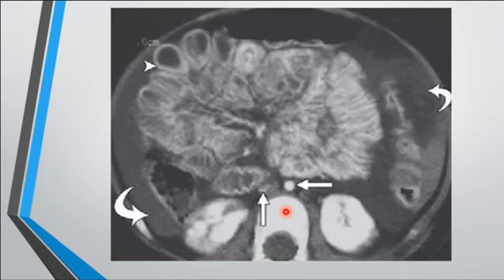So overall, bowel shock or hypoperfusion complex. Small caliber aorta. The vessels will contract in order to preserve flow to vital organs, like for example the brain, the heart, the kidneys, and to decrease perfusion to less vital organs like the upper and lower limbs. You might see the case: he looks well or relatively well, and then suddenly he deteriorates. When the body stops being able to compensate for the hypovolemia, suddenly the patient will collapse and die.